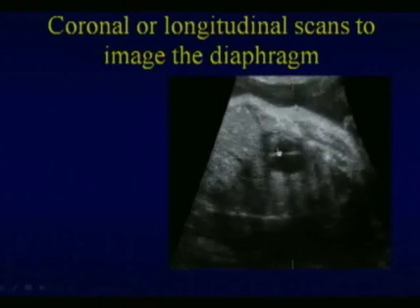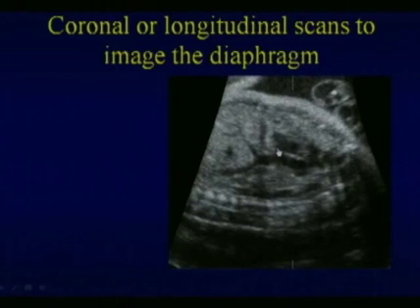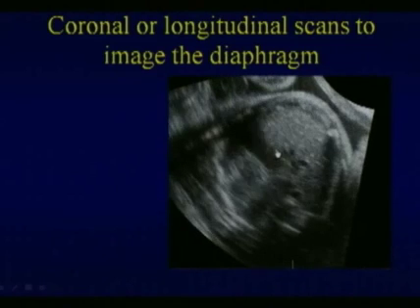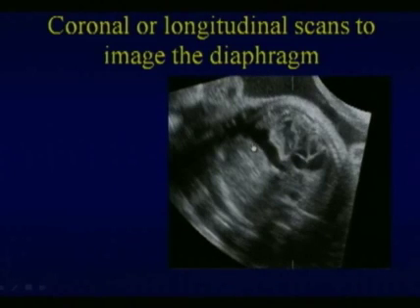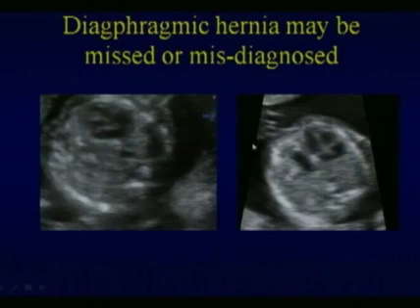and I think that we can ascertain the size of the diaphragmatic hernia actually very well in a direct way, rather than simply estimating it by looking at the degree of intrathoracic content. So think about looking at the diaphragm itself. I think there's a lot of information to be gained there.